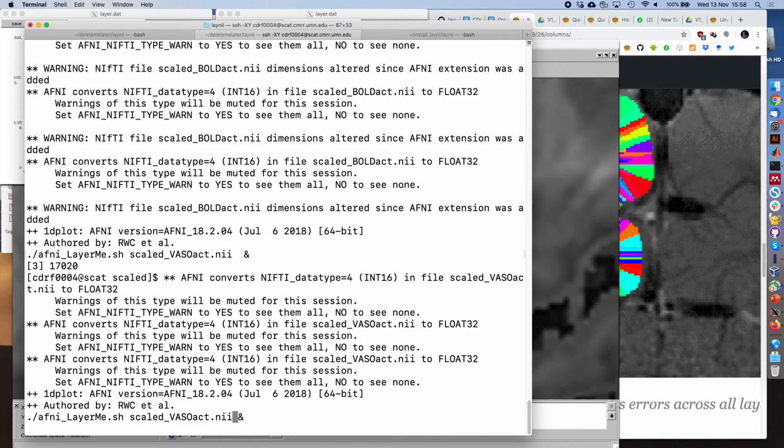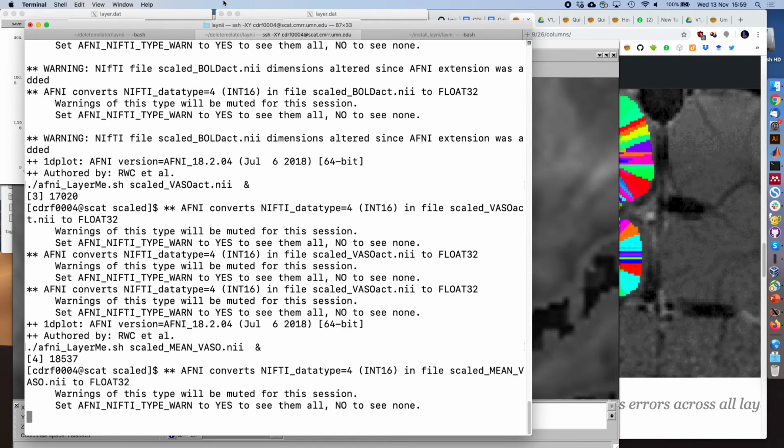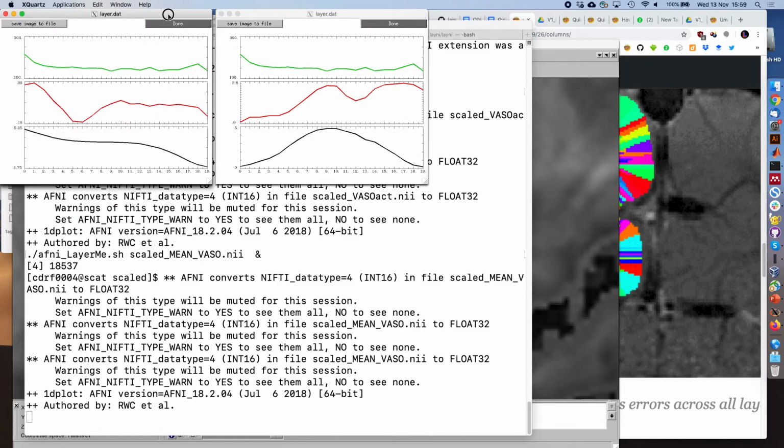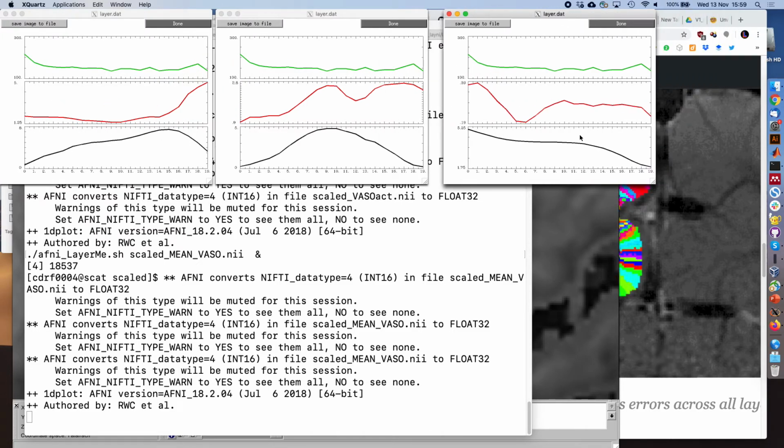Or yeah, maybe if you give me 5 minutes, then we will do 2 more things. We will look at the scaled mean, the anatomy, just as a reference, which is sometimes helpful. This is the T1 weighted signal, where you see that T1 is lower in the superficial layers. It's not a linear decrease, and this is particularly specific to the primary visual cortex, because there we have this kind of plateau, which sometimes becomes a dip, not always in the functional data.